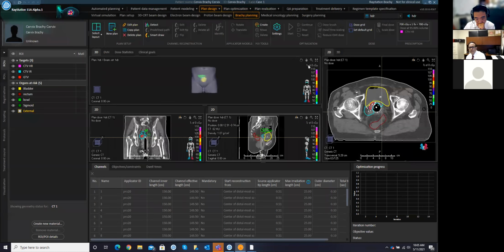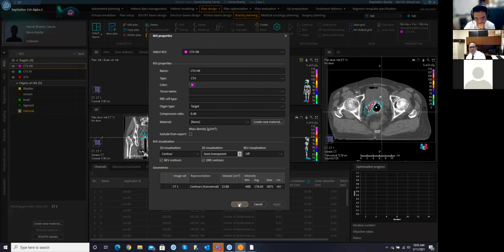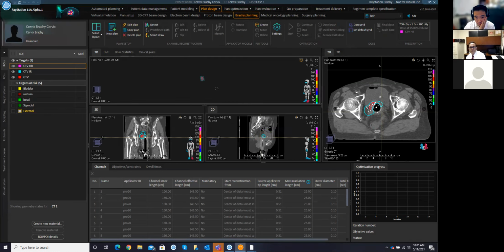So you can see here now that you have a 3D type setting for your images. I'll turn off some of this external stuff and change the visualizations. I should have done this before, sorry. So you can see you have all types of visualizations.